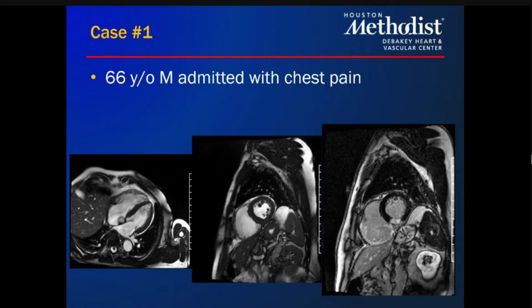So, George, what do you think happened to this patient? It looks like, at least given the involvement of the mid-inferior and then the RV, it looks like an infarct basically on the RCA.